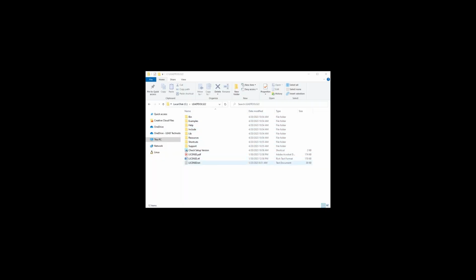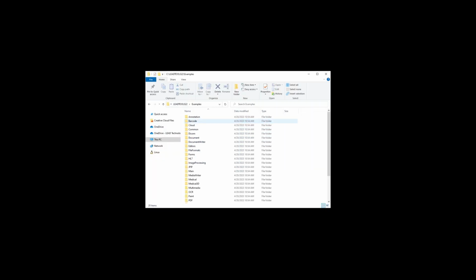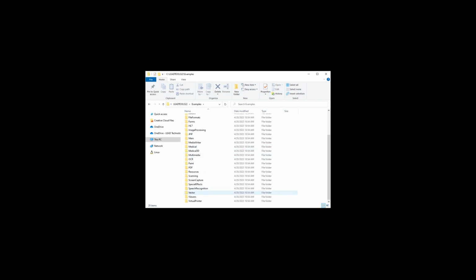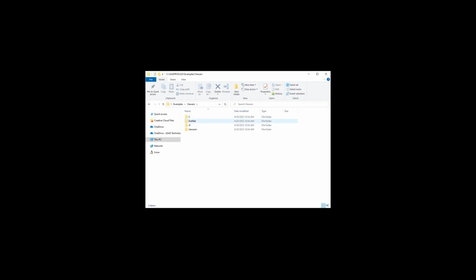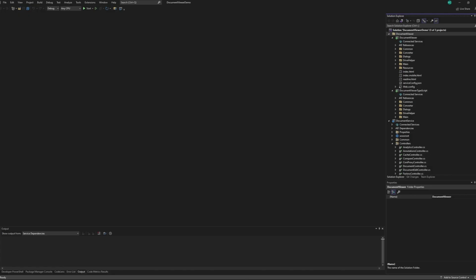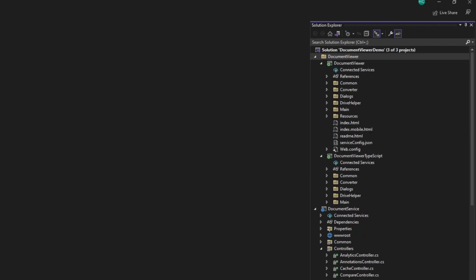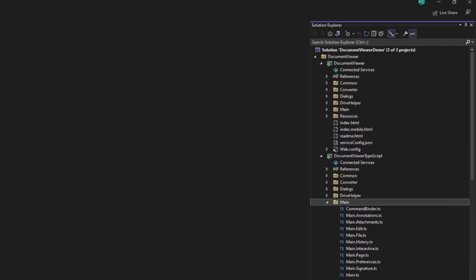Now that we've walked through some of the demos available on our website and the different functionality, I'm going to walk you through what's included when you install the LEADTOOLS SDK. You can download and install the full LEADTOOLS SDK directly from our site for a 60-day evaluation. The installation provides all the necessary binaries along with fully sourced example code for all the demos we've showcased, and many more. Let's navigate to the source code for the document viewer demo and load it in Visual Studio.